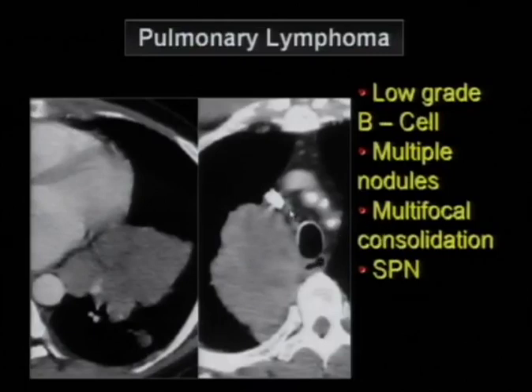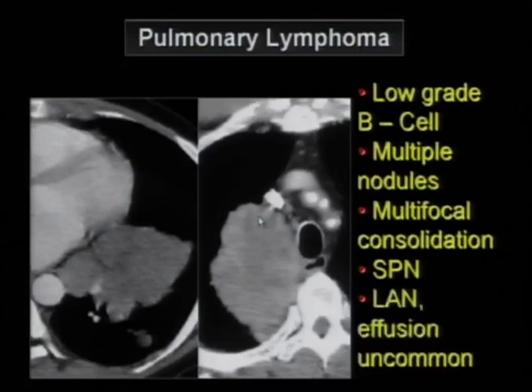We tend to see these lymphomas more commonly in severely immunocompromised patients, particularly patients with AIDS with low CD4 count. That's what you have here on your left. This is a patient with AIDS and low CD4 count, but not invariably. This patient here did not have evidence of AIDS, was an otherwise immunocompetent patient, just happened to develop a lymphoma in the lung. Whether you have AIDS or not with pulmonary lymphoma, it usually presents as an isolated lesion involving the lung itself as an organ and not within the lymph nodes, either mediastinum or hilum.